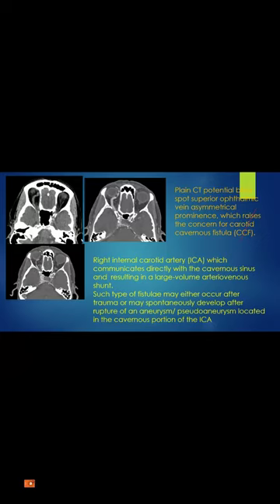on that side. And then again, the resident read the CT angio, but I did a direct comparison of that CT angio, and I saw a little halo of soft tissue surrounding that cavernous ICA that was not there 2 weeks ago, raising the concern of intramural hematoma or potential small dissection at this carotid siphon, probably caused by this type of surgery. So just make sure that you look carefully. That's important.